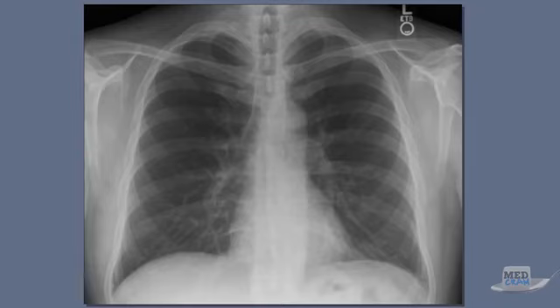So we go back to our normal chest x-ray once again. Remember, look at the airway for A, B for bone, see if there's any fractures, C is cardiac, look at the heart borders, D is for the diaphragm, look below the diaphragm for any free air, and look for equal lung fields on both sides, E and F. And then we're looking for pneumothoraces, we're looking for the vasculature, we're looking for air bronchograms, we're looking for pneumonia, the silhouette sign, all of those things.